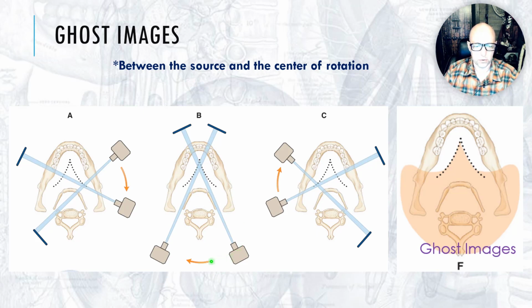So X-ray source behind it. The point of rotation has moved toward the midline. As you would expect, doing the anterior, that point of rotation should be right in the center. You want to open up those anterior contacts. And then C is showing as it continues around. So not quite making a 360-degree loop, but now we're finishing up that loop and we're imaging the right side.